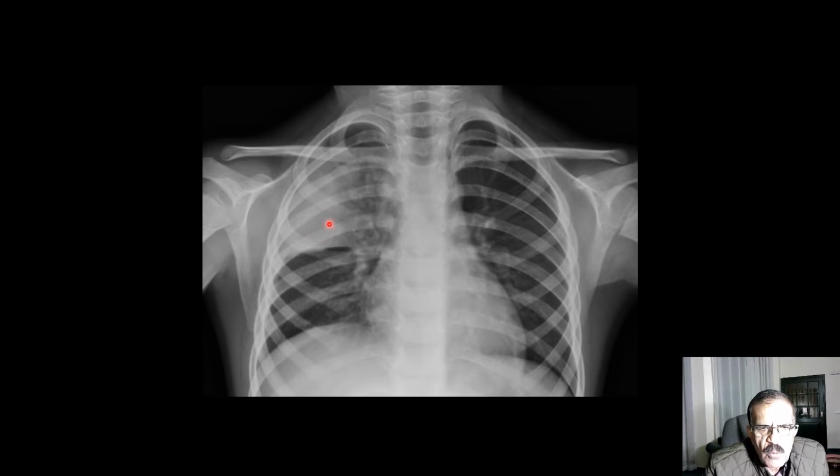Another point I would like to emphasize is that pneumonias, generally speaking, do not take up more space. Only the normal alveolar air is replaced by exudate. So there is no increase in volume and no loss of volume, so the neighboring structures remain in their normal position. This is the trachea, again in its normal position. This transverse fissure is again straight, it has not been pulled toward the opacity, so this is very likely to be consolidation, pneumonia.